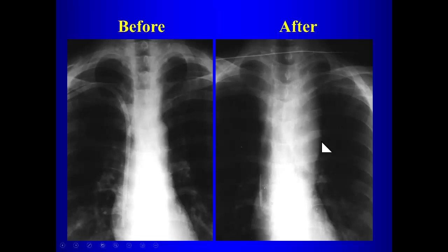Aortic dissection. Not dissection, this is from a line placement. You're thinking about hematoma, right? So there's been injury to a blood vessel, could be a venous vessel too, but there's some kind of vascular injury that's resulting in bleeding into the mediastinum. So acute widening of the mediastinum like that is an indication of mediastinal hematoma.